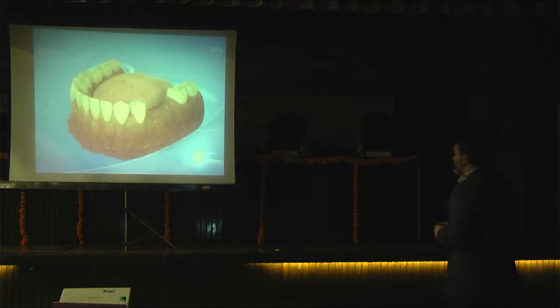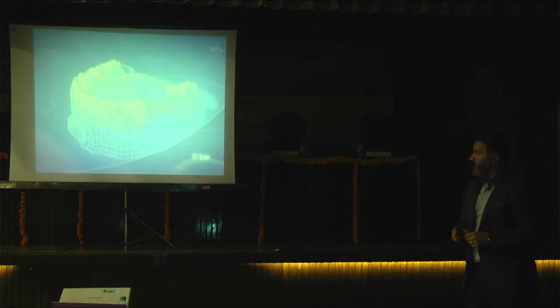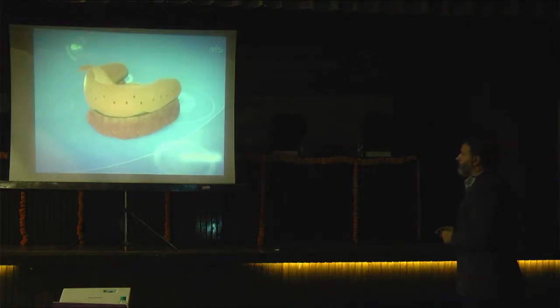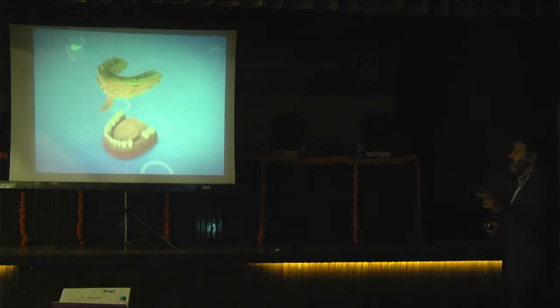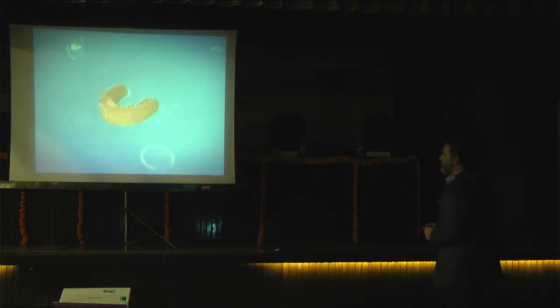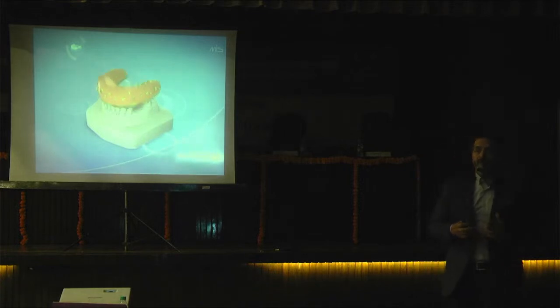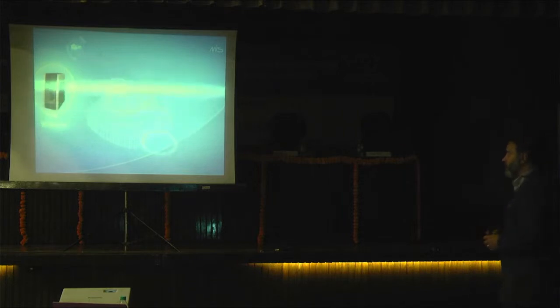This is the lower jaw. I have missing teeth, number 30, 36, and 37. No, 35 and 36. First, we get the CT scan with tomography. Second, we get the impression and create a stone model which will be scanned extraorally. Sometimes we can do intraoral scanning in our clinic, and I do now.